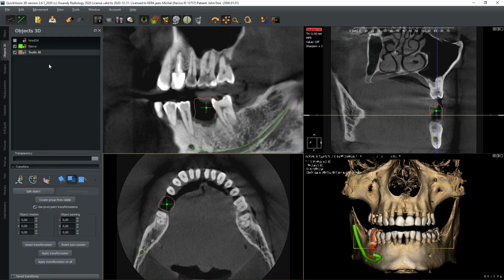I'm able to turn it from each view, turn around the point, the way to align. We may also resize the object, and I will place my object correctly.